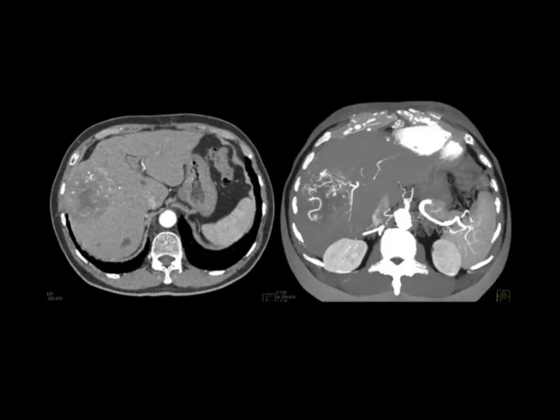And I've always made the point that you can pick up small vascular lesions on MIP imaging that you don't see on axial CT, and also you can pick up neovascularity that you tend to underappreciate. So what lesions give you neovascularity in the liver? Well, there's a number of possibilities, primary and metastatic. And hepatoma is the classic one, and this liver is nodular or cirrhotic, so hepatoma is going to be the answer. Cholangiocarcinoma typically is more homogeneous.